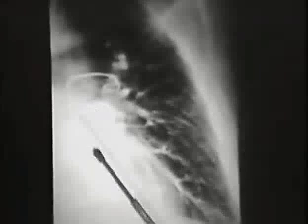The frontal view shows how the left upper pulmonary vein is quite buried in the hilar shadow. It's usually quite well obscured by the shadow of the pulmonary artery and is rarely perceived on the plain chest film on the left side. The right side, on the other hand, as I mentioned, the pulmonary vein may become displaced and distended by a combination of pulmonary venous hypertension and enlargement of the right pulmonary artery, which also will occur when there is significant heart failure. So you see here, for example, that the vein from the upper lobes is bigger than the vein from the lower and middle lobes, and therefore has quite an abnormal contour, which is visible on the plain film of the chest.